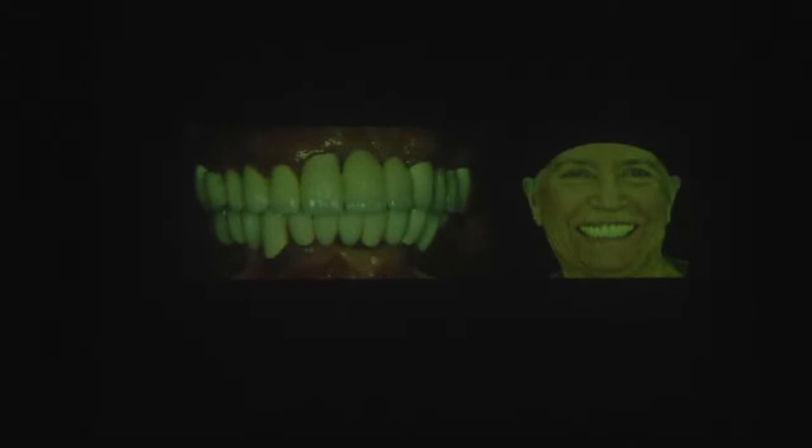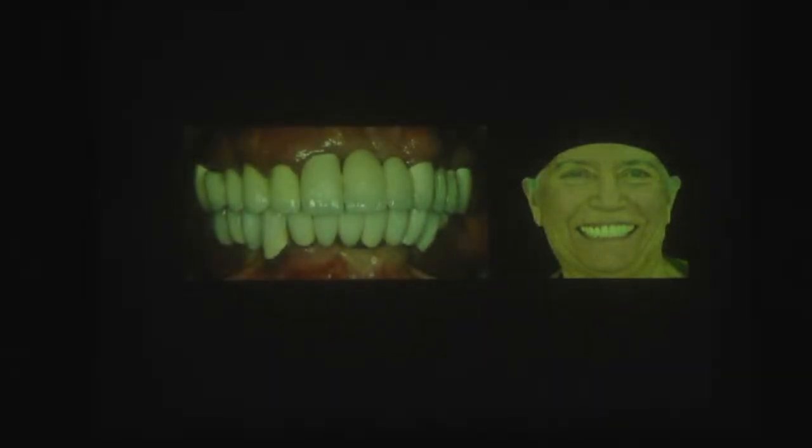She is an older lady, a little overweight, with type 2 diabetes. We had a very big cooperation problem, and I was not sure about her post-operative oral hygiene, but I took my chance and told her everything about the maintenance phase, which is very important. You see infection everywhere, and cracks: a total clearance case. We call it a total clearance case.